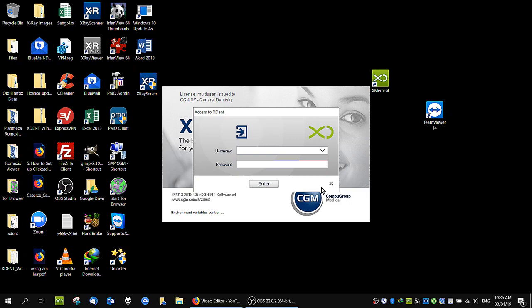This video is to show users or customers a general view of XDent, which I will scroll you through, the whole program.